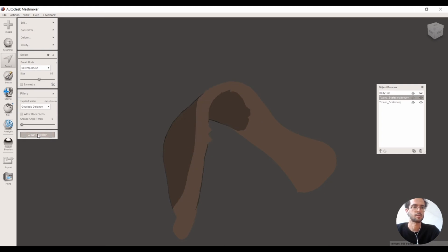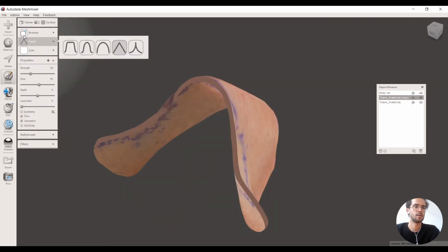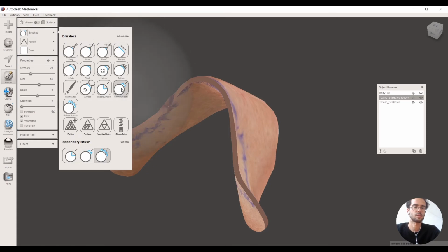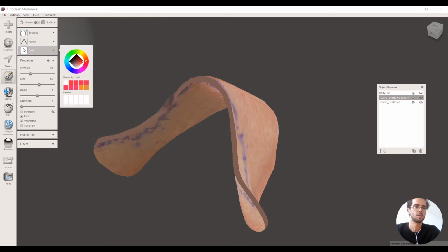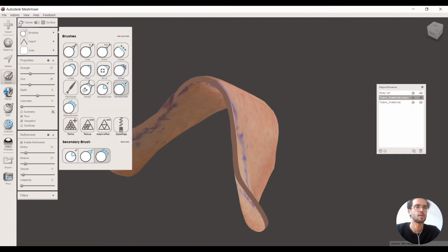So I can clear selection, go to sculpt mode, and use some shrink smooth brush, make the size a bit smaller, and I can make a correction and refine a little with the same intensity of reduce, so we'll keep almost everything together with a bit of smoothing.